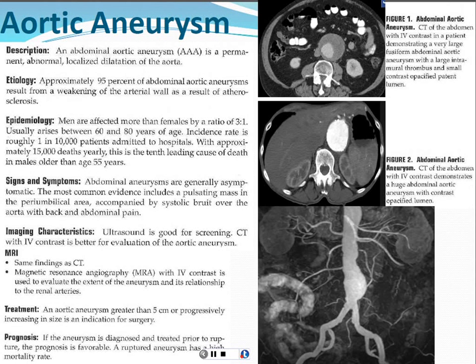As far as MRI goes, you may be using MRI to evaluate an aneurysm, either for screening or to evaluate for progression of them. It's physician dependent which kind of study they prefer. Frequently we do see CT used for this, but you can see that they can do some really beautiful MR images of it. This is the part of the aorta that's become focally dilated distally.